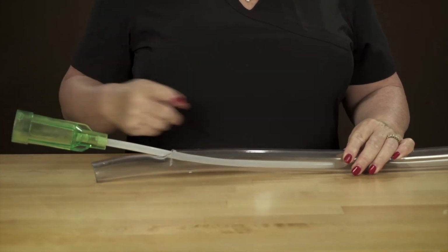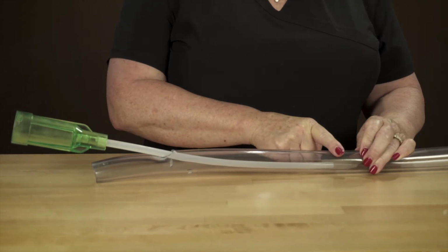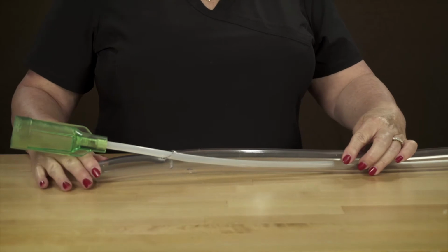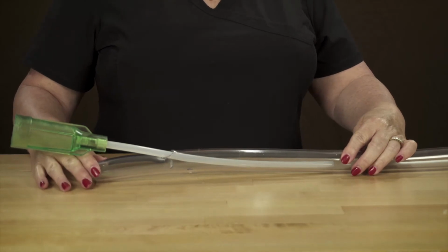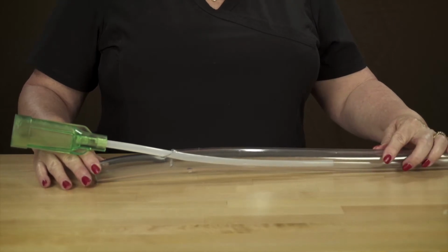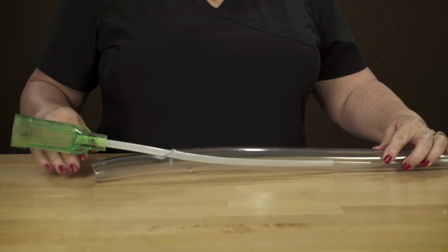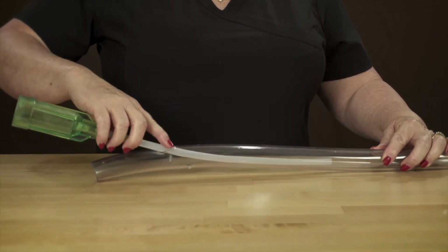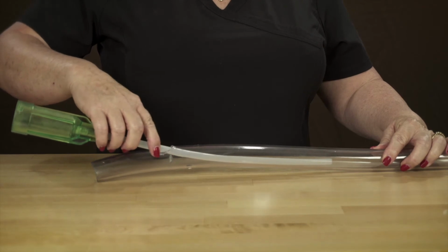Then point to the tip of the cannula where the medication is delivered, and the clinician will quickly understand the medication is delivered full strength without the benefit of good hemodilution, where the blood would normally buffer and help prevent chemical phlebitis. Point out with this cannula that the exit site is larger and more susceptible to bacterial phlebitis.